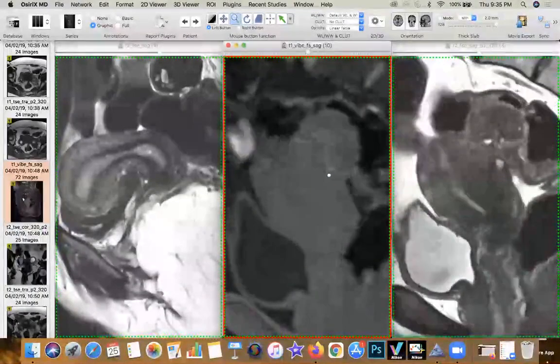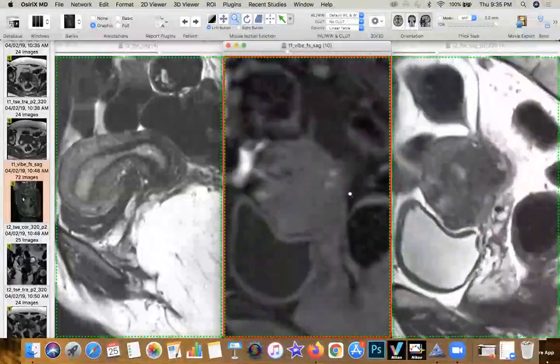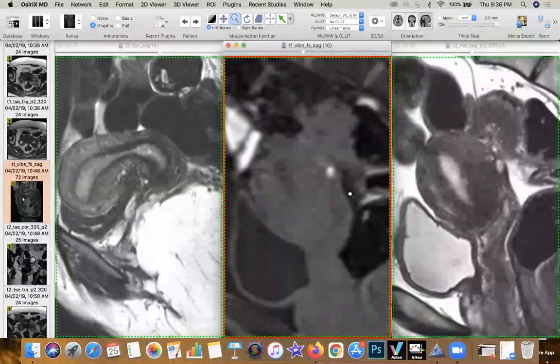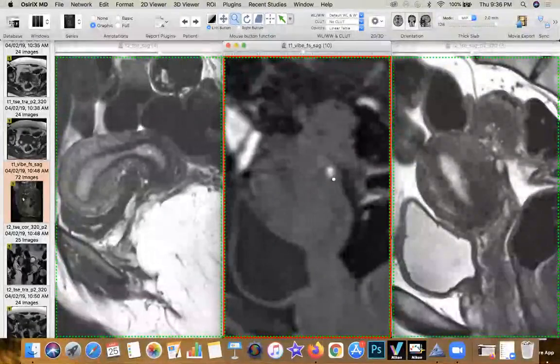If you start going a little more off center, on either side, you'll start seeing a few more specks of hemorrhage along the lateral aspect of the thickening itself. So now when you've got these two points going in, plaque-like thickening, change in the contouring, without a mass-like lesion, multiple areas of T2 brightness just beneath the scar, one of which is very bright on the T1, you're probably looking at a form fruste of a mid-cul-de-sac pattern of deep pelvic endometriosis.